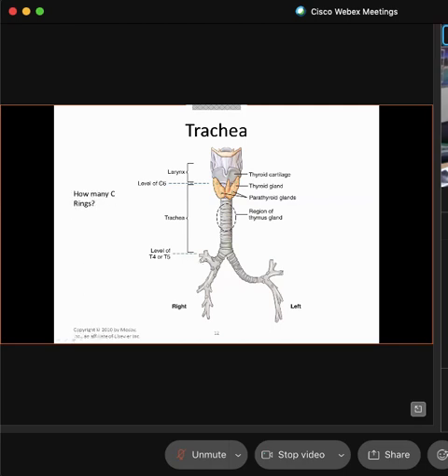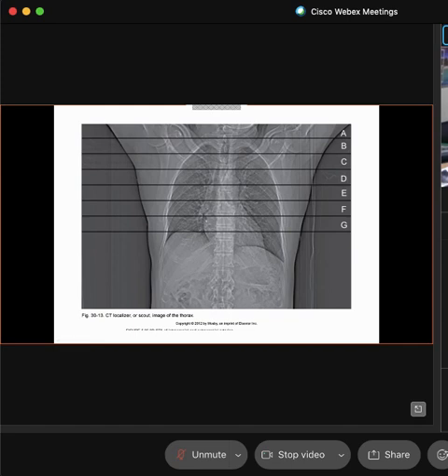Well, when we start to get to images, axial imaging, we know that if we were going to separate all of these slices away from each other, let's just say we moved A away from B and B away from C and so on and so forth, now we have to go back and figure out how we would put this puzzle back together based on what we see. In this image, we see humeri.